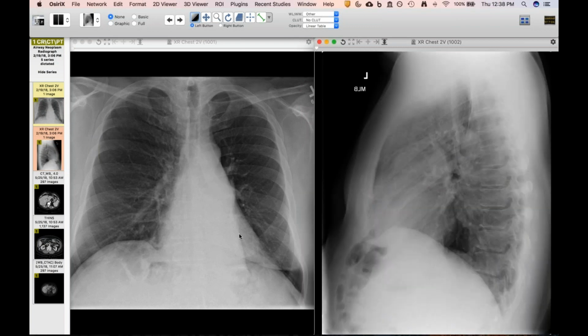So on the PA radiograph, I think we all noticed this, first of all, this extra contour here behind the heart, the medial portion, you lose the diaphragm, it's socked in. Great look for left lower lobe atelectasis. You can also notice the remaining left upper lobe looks a little hyperinflated with a little more spaced out vessels than you see on the right. And I think it's a nice example, subtle spine sign here, and then you can see the entire right hemidiaphragm, but lose the left hemidiaphragm right there.